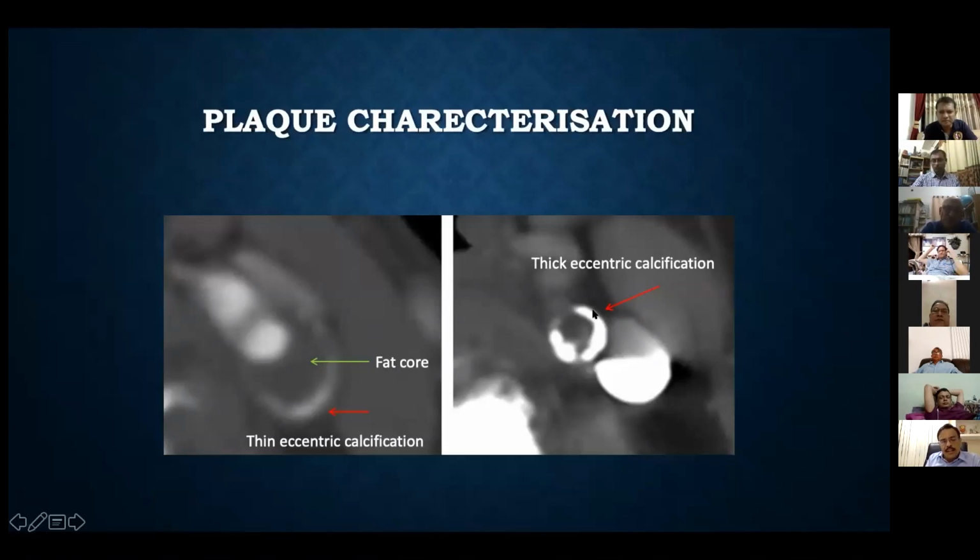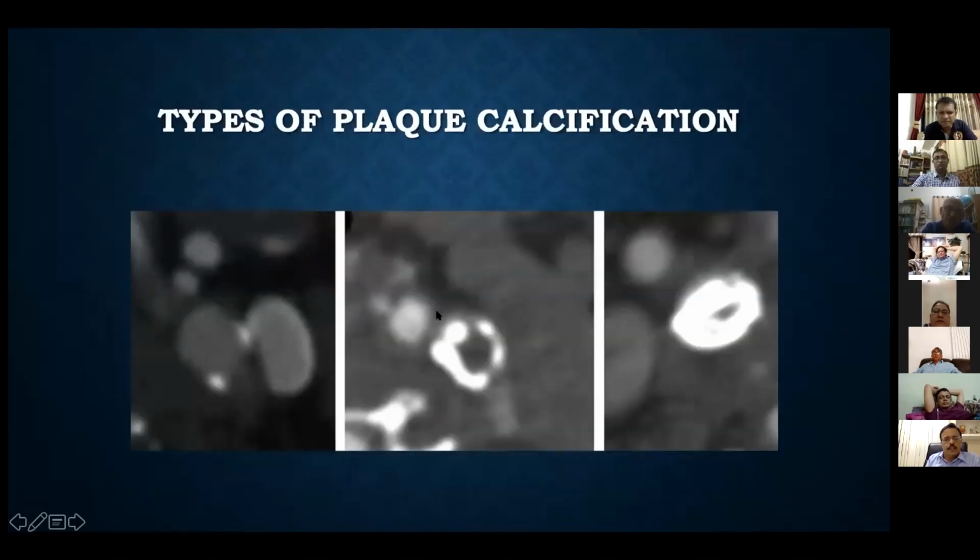The calcification is also very important, whether it's concentric or eccentric in nature. Sometimes calcification can be speck-like, it doesn't matter, or it can be circumferential but not complete. Even these cases are good for stenting, but when it is circumferential and dense calcification, these are the only cases where you will warn the interventionist that stenting may not be a good option, but it's very infrequent to have something like this.